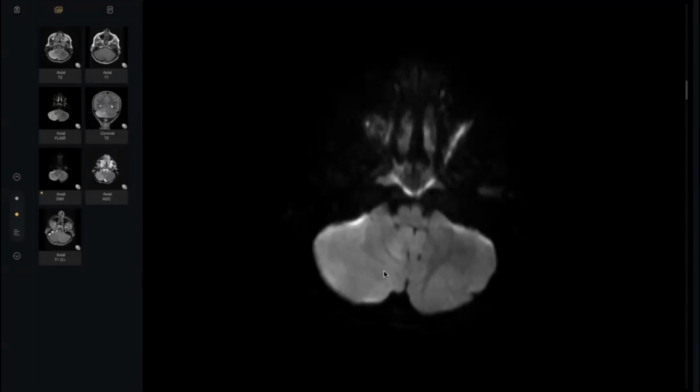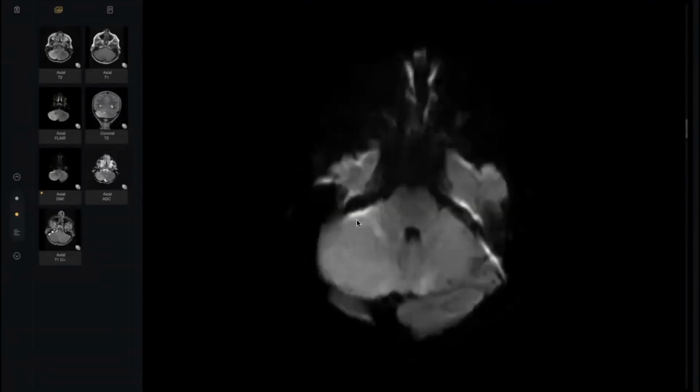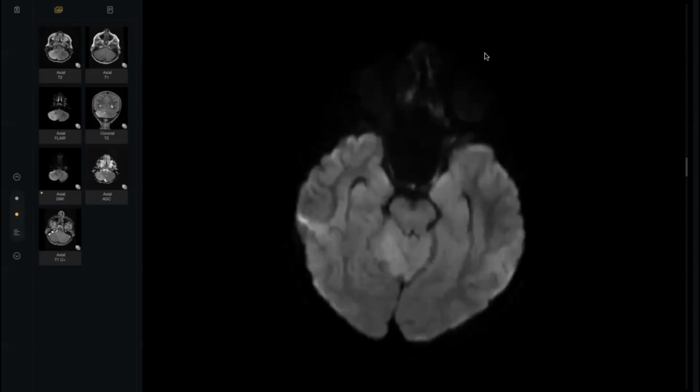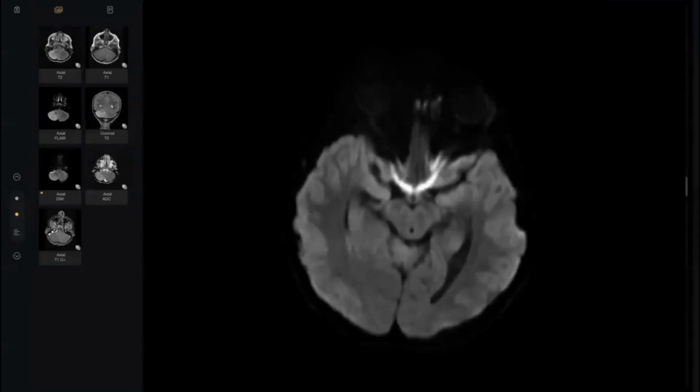Sir, cerebellitis. Okay. Cerebellitis. This is a child and they have a cerebellitis. Okay. Thank you, doctor, so much.